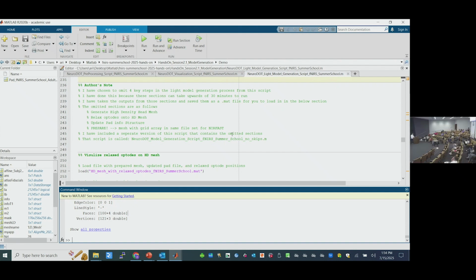So when you're positioning the Z values, like you're increasing manually, right? Yeah. So for a first-time user, how do we know we are doing it right? And would the photos during the session help us? The photos during the session would definitely help you, just for getting the positioning. And then the last thing is just, instead of it touching the mesh before you hit the start button on the relaxation process, just have it a tiny bit off the mesh. But other than that, using your photos to position the array is the best way to go.